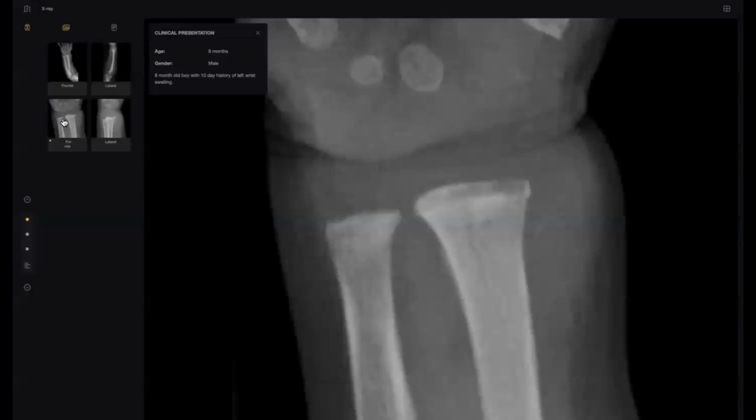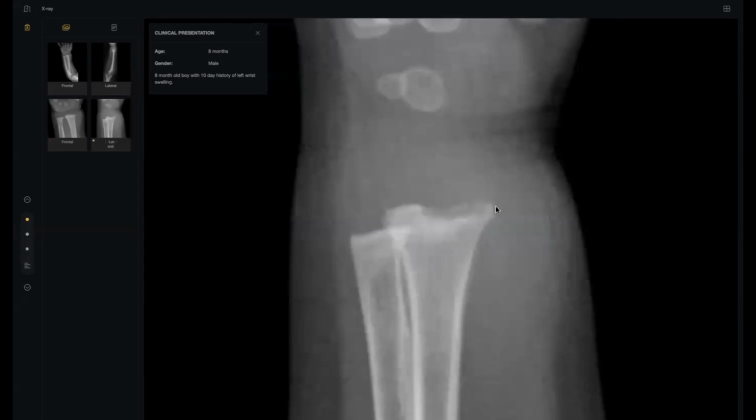I have one chest X-ray, and I think the examiner gave me a good mark because I talked about zooming. I will zoom to rule out this, despite the pathology being somewhere else. I was very far from the pathology, but he liked the technique. We will zoom in our routine practice. After zooming, you will find something.